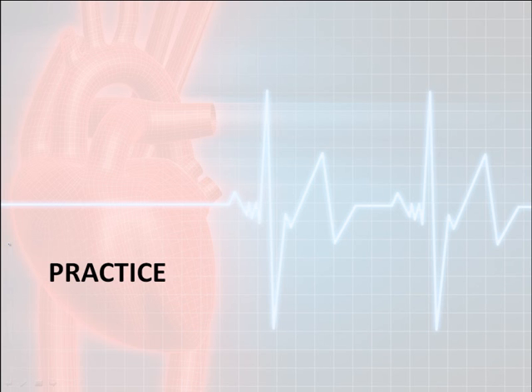So let's go ahead and practice a little bit. I'm going to practice these 12 leads using the 6-step interpretational process. If you have not seen any of the other videos, then you're probably not going to understand quite what I'm talking about here, and you're welcome to go view all of those to bring you up to speed a little bit. So let's go ahead and get started.